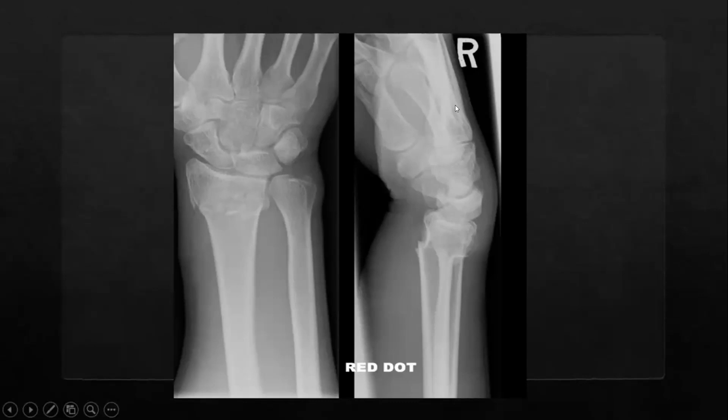So this is the dorsum of the hand, and this is the palm of the hand, or the volar aspect. So actually, there's dorsal angulation and dorsal displacement. Does that make sense, everyone? Let me know in the chat if that does. Okay, but the rest of your presentation was fantastic, brilliant.